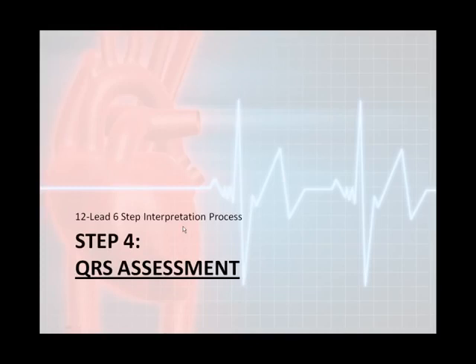Step 4 is actually the QRS assessment. Now, we're not going to get heavily into the QRS assessment because the QRS assessment and the rest of these steps are actually specific components in this course. So for step 4, I'm just going to briefly cover the rest of these, and then we'll practice a little bit using the first 3 steps, the general impression, calibration, and the rhythm interpretation.